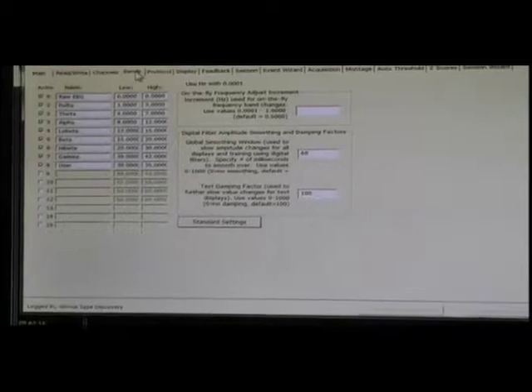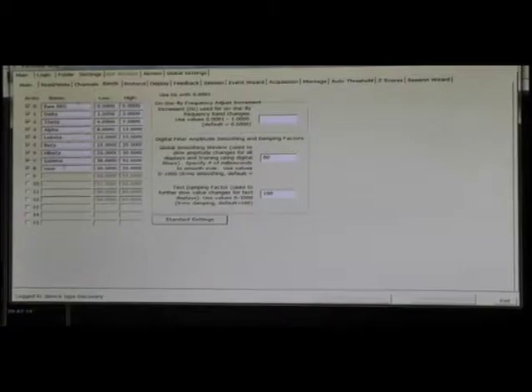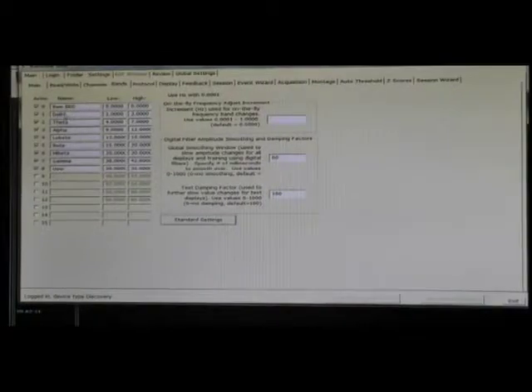Okay? As I go to my next tab over, it is bands. This is just telling you the components currently selected. We have 8 components selected. They're defined. We have our raw EEG, our delta, theta, alpha, low beta, beta, high beta, and gamma in user.